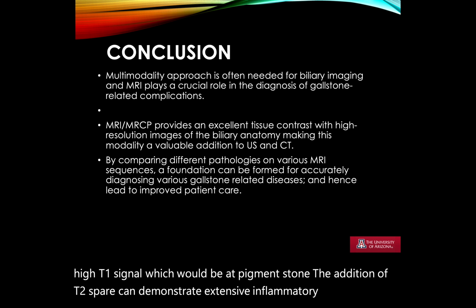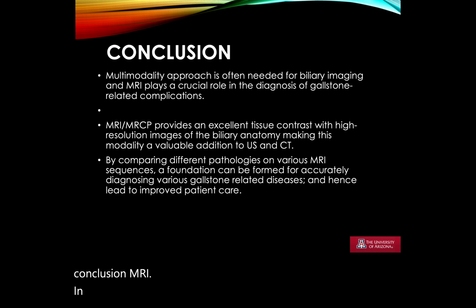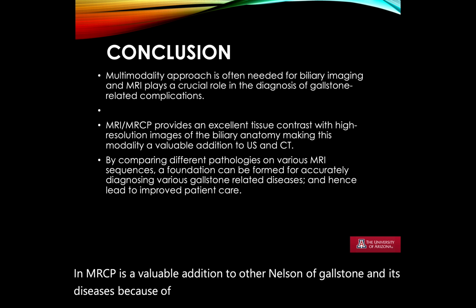In conclusion, MRI and MRCP is a valuable addition to the diagnosis of gallstones and their diseases because of its high resolution as well as tissue contrast.